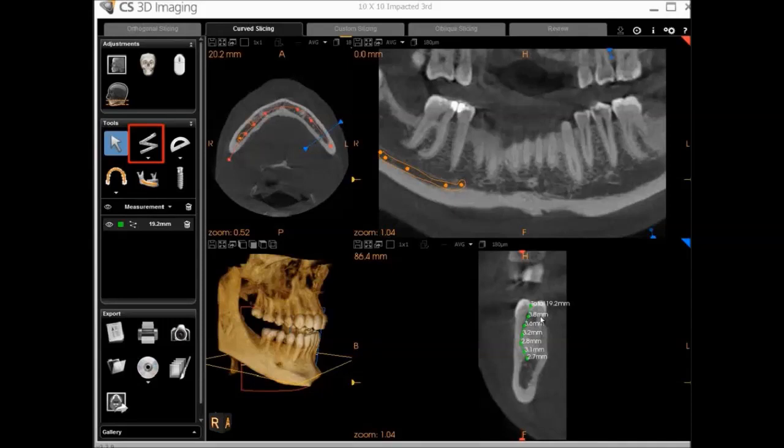As before, a multi-polyline tool is an icon with a thumbtack over it. It enables you to draw repeated polylines without reselecting the tool.